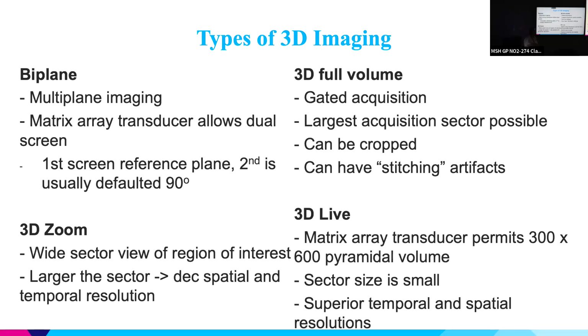And then the last is 3D Live. In my opinion, 3D Live has the best resolution. I actually asked Philips about this once, and they said that it does. I asked why, and why can't they make all of the other ones the same? And they said because the engineer that created 3D Live retired, and he didn't tell anyone the secret before he left. This is a true story.